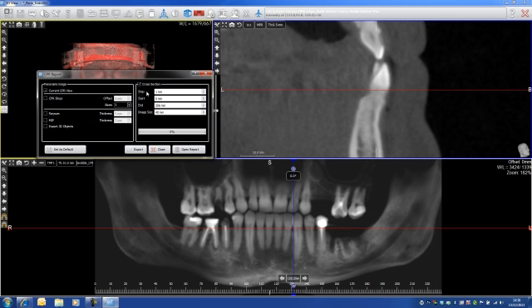Okay, the step is how many images you want to have every millimeter. You can increase this step or leave it on 1 millimeter. Normally, it's 1 millimeter that is being used. The starting point and the ending point. So let's say that I want to start from 60 to 120. I just select here 60 and here 120.